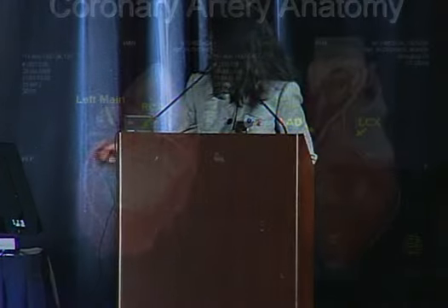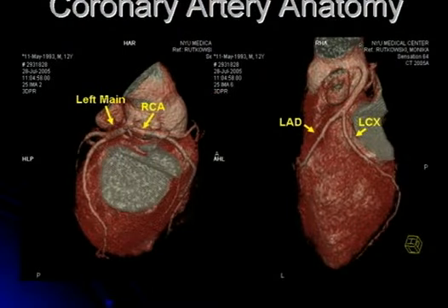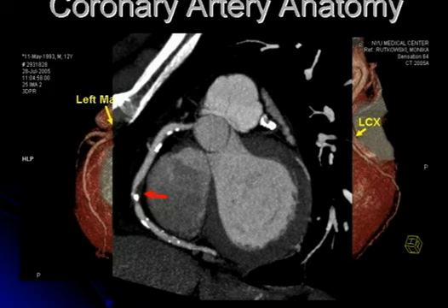Dr. Jacobs touched upon different unique aspects of CT imaging used in cardiovascular applications, and focused mainly on using CT for looking at the coronary arteries. She showed some excellent examples showing that with cardiac CT imaging, we can get great visualization of the coronary arteries, both for diagnosing anomalous coronary artery origins, such as this example of a single left coronary system giving rise to both the left and right arteries, and also its utility in diagnosing coronary artery disease and characterizing plaque.